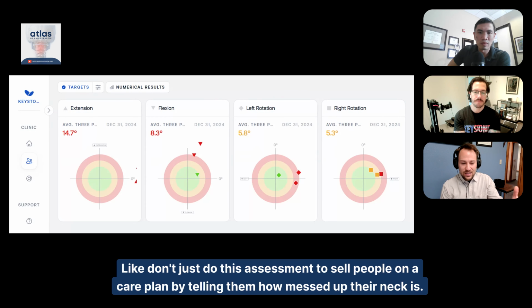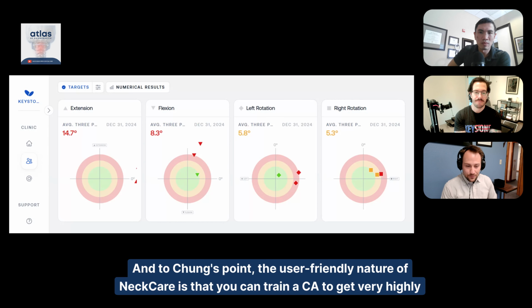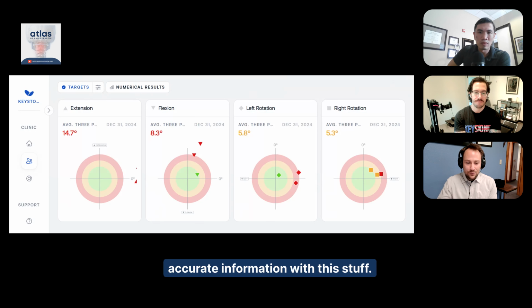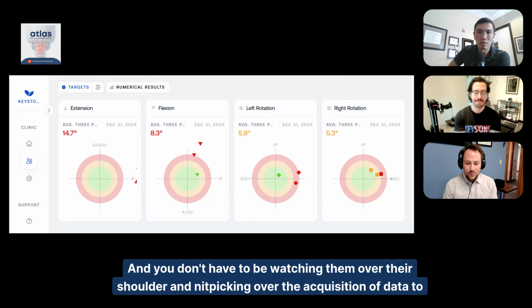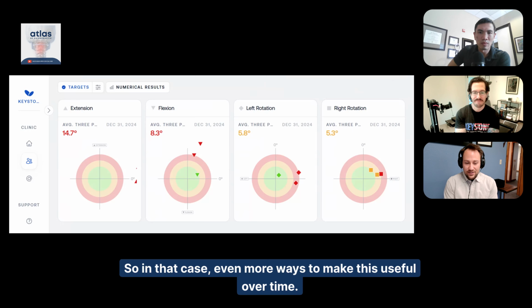Don't just do this assessment to sell people on a care plan by telling them how messed up their neck is, and not measure it and actually track progress over time. Gather these assessments. To Chung's point, it's the user friendly nature of NeckCare that you can train a CA to get very highly accurate information with this stuff, and you don't have to be watching them over their shoulder and nitpicking over the acquisition of data to know if you got something done right. So in that case, there are even more ways to make this useful over time.